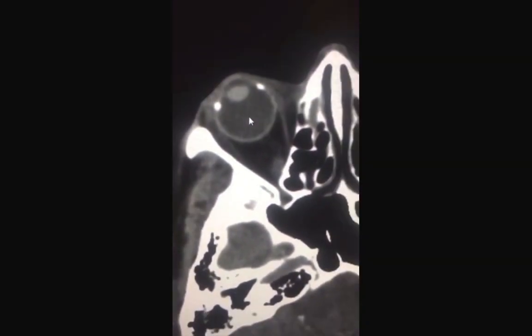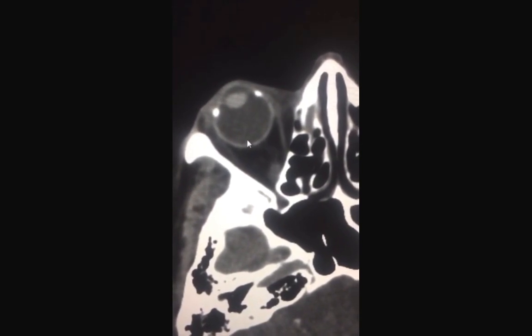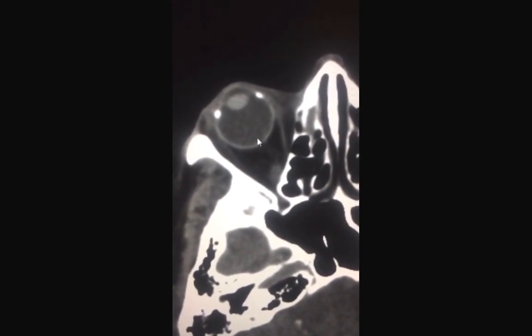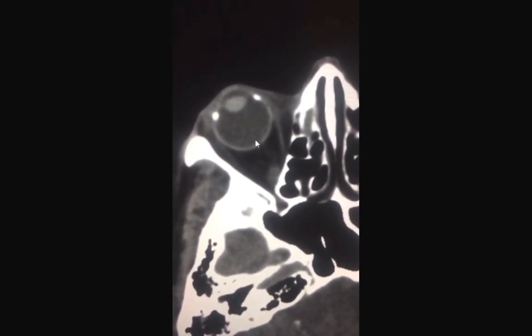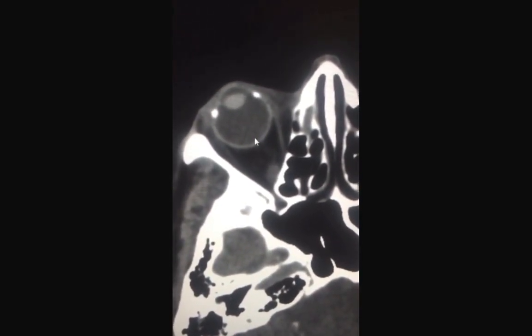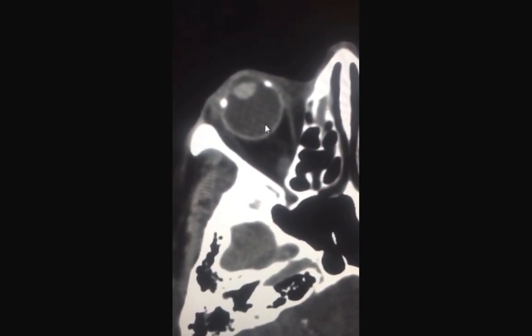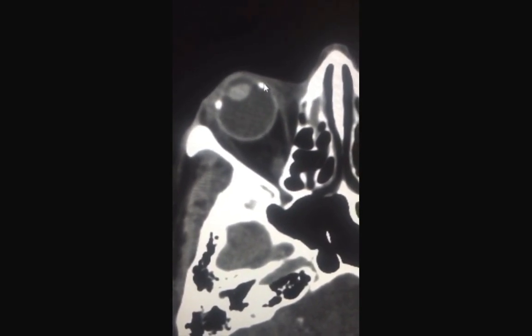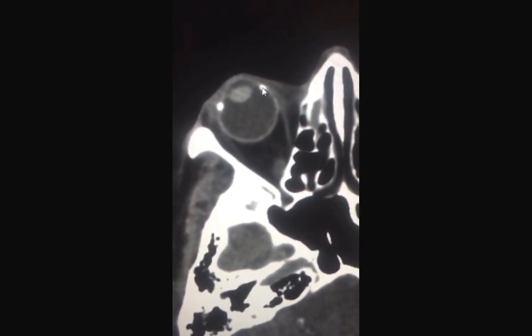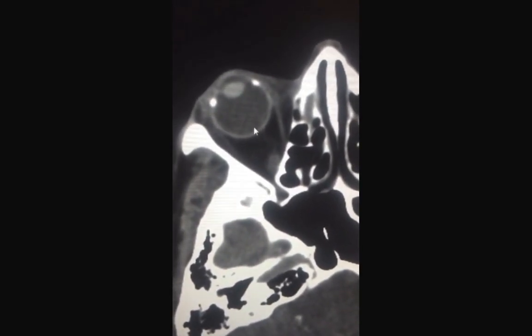When you have detachment of the retina or detachment of the choroid from various causes, you're going to have bleeding beneath that membrane. Such detachment would present itself as hyperdense material within the vitreous fluid. If this were to be retinal detachment, we know the retina should not extend beyond the ora serrata anteriorly, while hemorrhage from choroidal detachment would extend all the way anteriorly.